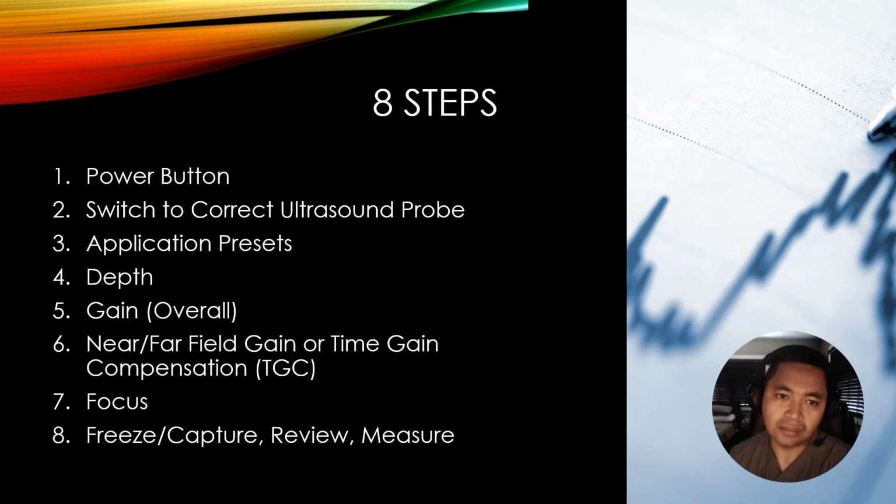These are the 8 key steps that I will be discussing. It covers powering up the machine, to adjusting the image, and then finally to image capture and basic caliper measurements. I will go through these steps one by one.